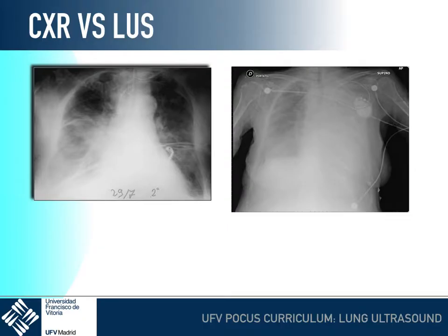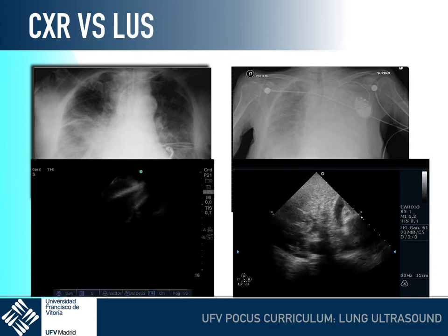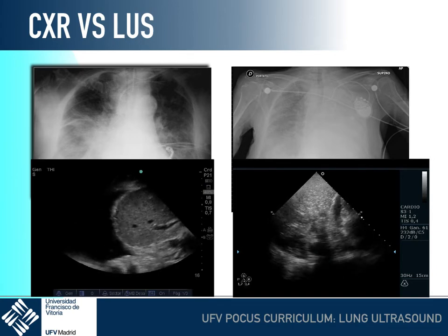The last part of this lesson is the effusion. In some cases, we have to face these situations in our daily practice. Two chest x-rays with the possibility of effusion, atelectasis, consolidation. So what's what? What is the left one? Can we use a needle to decompress the second one? The use of ultrasound facilitates a lot of these kinds of decisions.